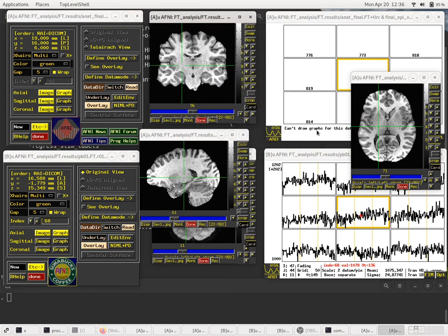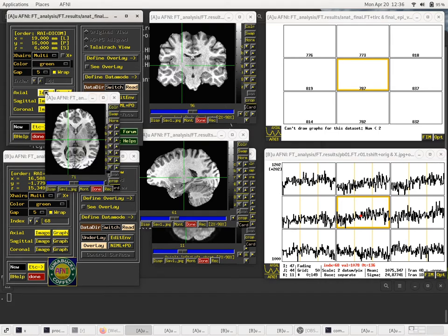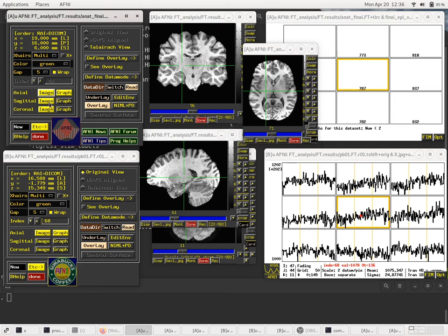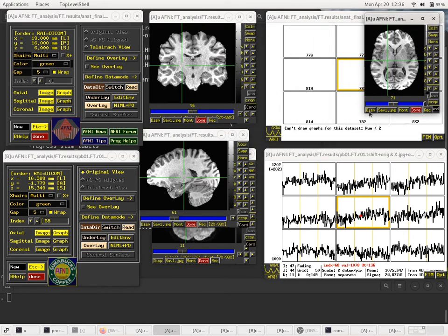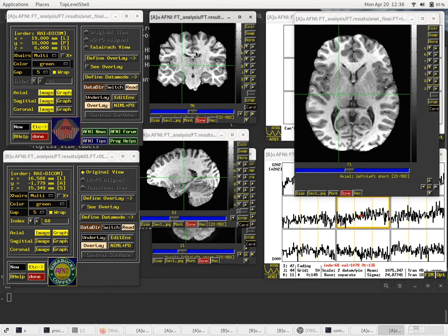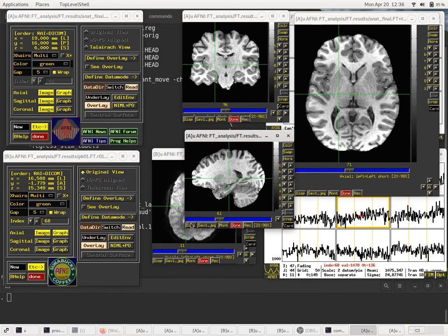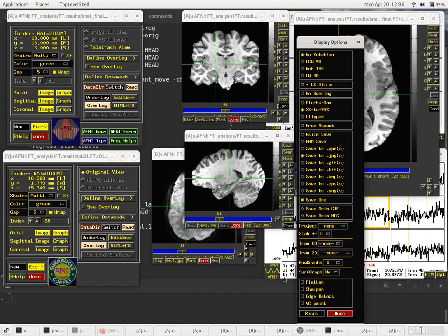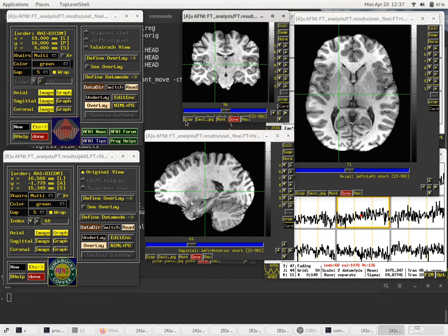And we can adjust these windows to be a little bit bigger. Where did that go? Where's my axial image window? So I right-clicked on the image window, since something I did lost it with these new fangled modern desktops that try to be intelligent to do things you don't like. Oops. Just making these a little bit bigger.